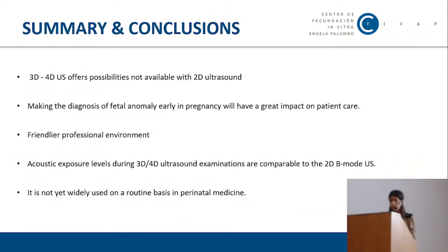So to summarize, 3D and 4D ultrasound offers possibilities not available with 2D ultrasound. Making the diagnosis of fetal anomaly early in pregnancy will have a great impact on patient care. With this new technology, we have increased not only our knowledge about fetal development, but also the impressive images obtained with HD Live offer us the occasion to feel closer to our patients, and we can establish a friendlier professional environment that is useful during monitoring the pregnancy.